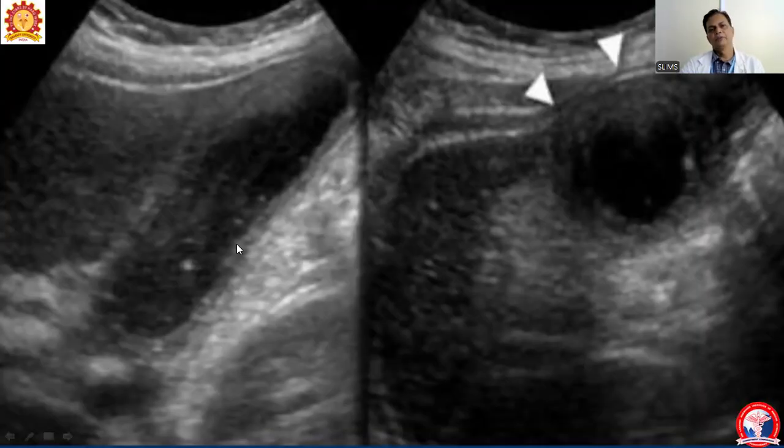And here we come to very important features when there is cholecystitis. Ultrasound is a very commonly used modality to diagnose cholecystitis, and it's diagnostically very important. What we get to see in cholecystitis is an edematous thickened wall. Normally, it shouldn't exceed more than 2 mm to 3 mm. So this is almost a 4 or 5 mm wall. Here, the gallbladder has a thickened wall.